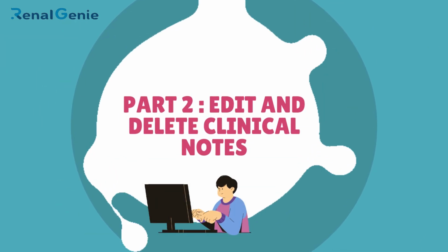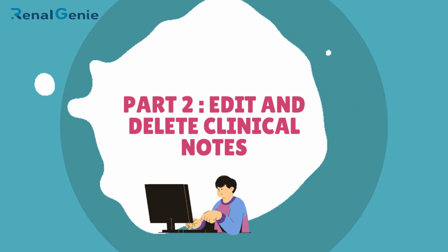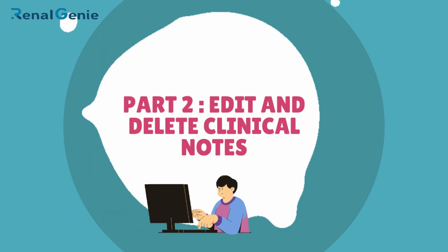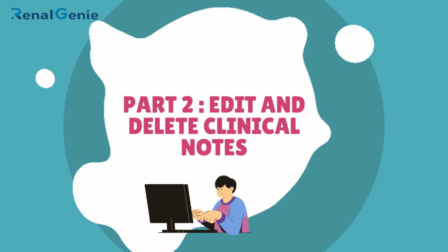Now let's see how to edit and delete the notes. Please remember that you can only edit or delete notes that you have created. Notes created by others cannot be edited or deleted by you.